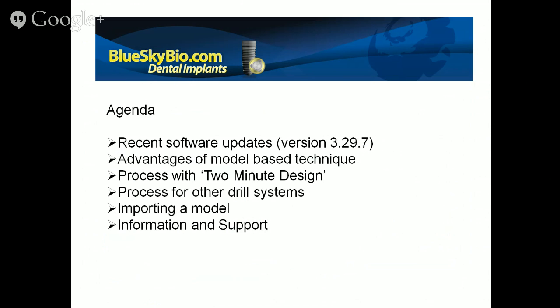We're going to discuss importing a model, which we're assuming for this presentation that you have general background and you're able to use the software on a pretty good level. But we're going to be discussing importing a model because if it's done properly, it's a quick and accurate process. And I think it's important to touch on that. So we're going to be demonstrating that as well and pointing out where you could get more information and support regarding the process.